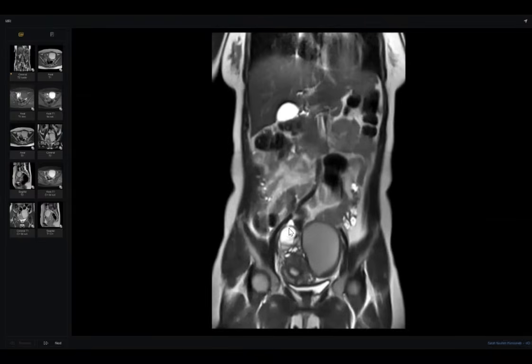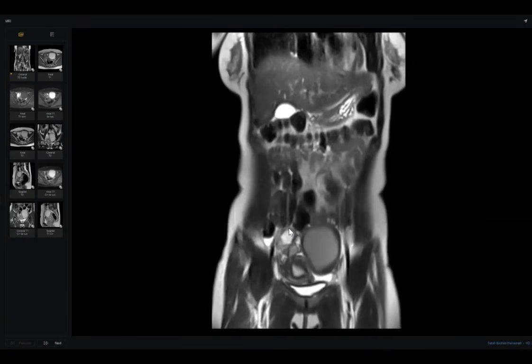So what's your concern, or what's your diagnosis? Based on this imaging, the primary diagnosis is endometriomas, bilateral ovarian endometriomas, since they do not suppress on fat sat. However, the differential also includes any ovarian lesions containing pus or high proteinaceous contents like abscesses. Sometimes they can also present with high intensity material. The patient's history is bleeding. Give me one clue and one final diagnosis.